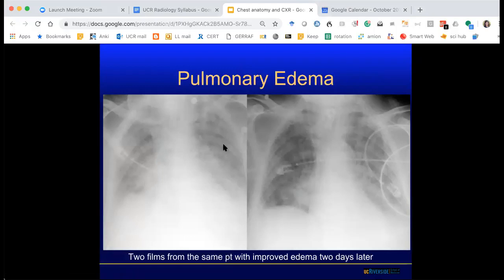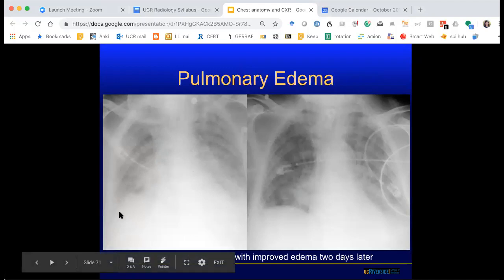The lung volumes are kind of low bilaterally, and then I look at the parenchyma. You see this perihilar opacity. It's pretty severe, in a central perihilar distribution. The costophrenic angles I don't see well here on the right side. The left is excluded in the field of view. The heart is big. So this is CHF.